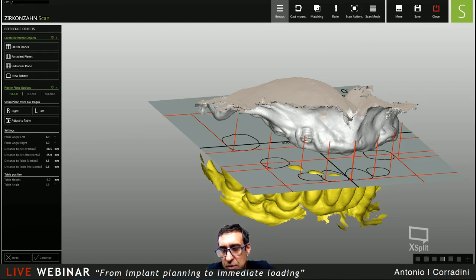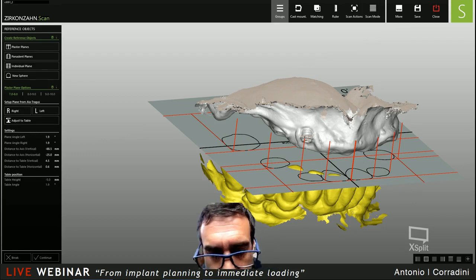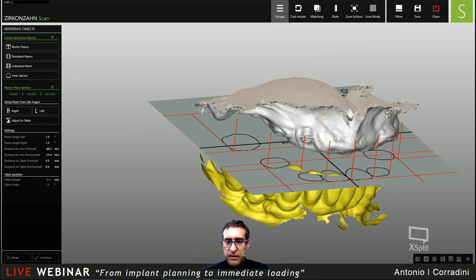Once you load and save this plate here in the scan software, when you switch to the Modifier software, the anatomy will stick immediately and really easily to this position. So it really helps us save time. I can show you later when we are in the Modifier. That's a great advantage.